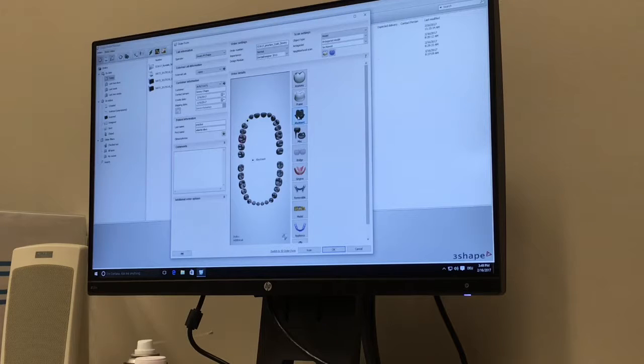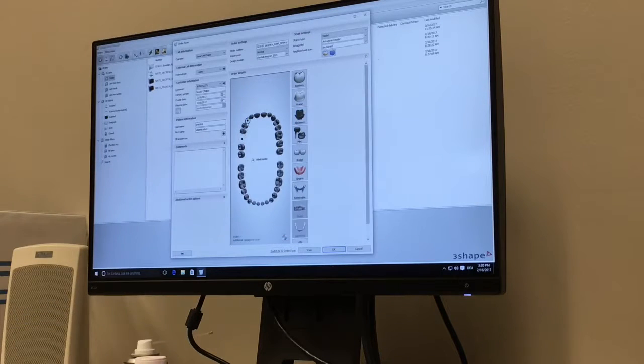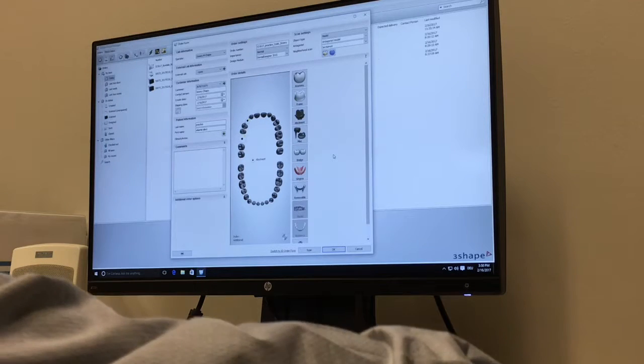Now the next abutment is gonna be right there. Apply implant. Oh, that's not the right one. Okay, and then the OsseoSpeed EV 5.4 brown. Okay. So now you've chosen each of those. You make sure that you got the right ones and not copy this one onto this one. It happened to me already, so fair warning.